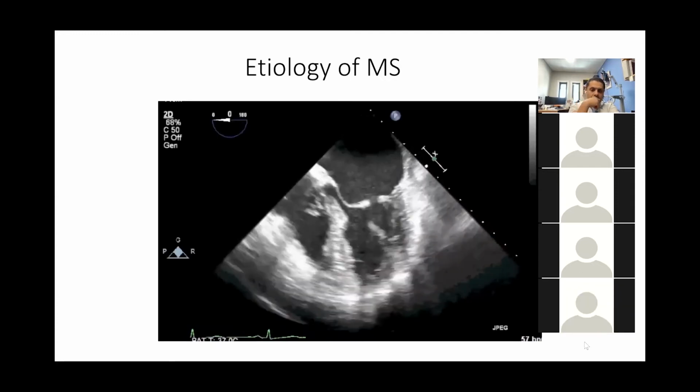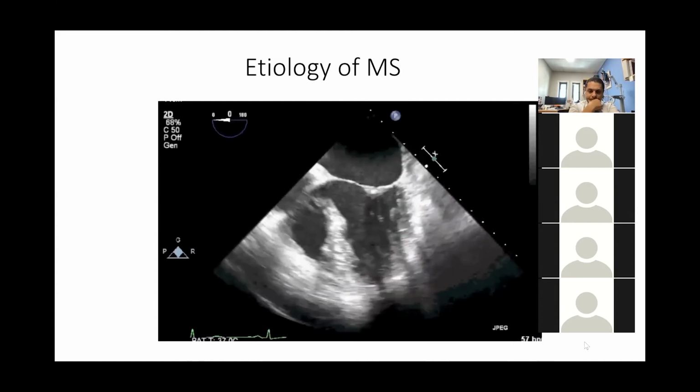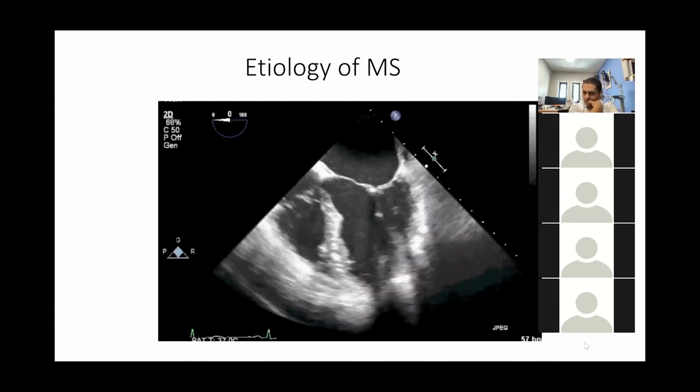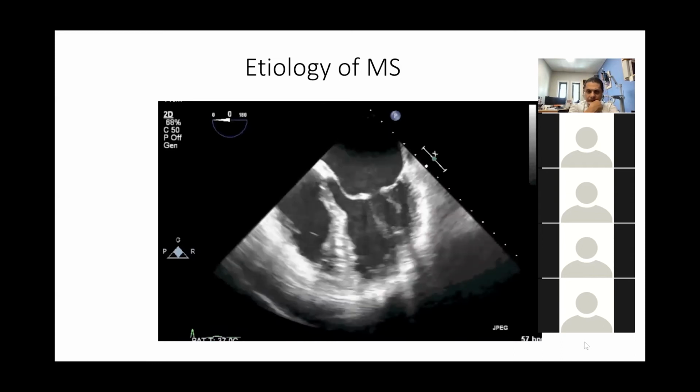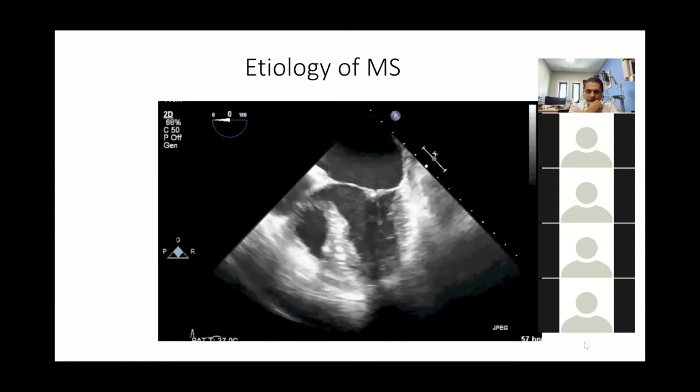Next one, Samar, are you with me? Yes, I am. Sorry, Vishal. So next one, you can take this one. Look, I'm not good at TOEs, so I believe this is a TOE image. Is that correct? Yes.